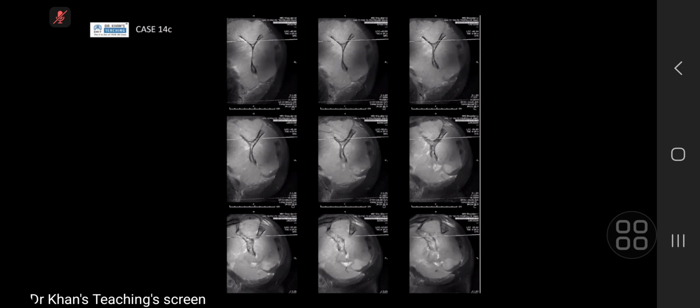So this is the second most common primary bone malignancy in children after an osteosarcoma, and it has caused cortical destruction, and I see some pooling of contrast within. The lesion is quite big and involving multiple muscles around. My differential would be again an Ewing sarcoma. Yeah. Excellent, good. And part of assessing any bone tumor, particularly Ewing's, what would you be doing? What's the next step?